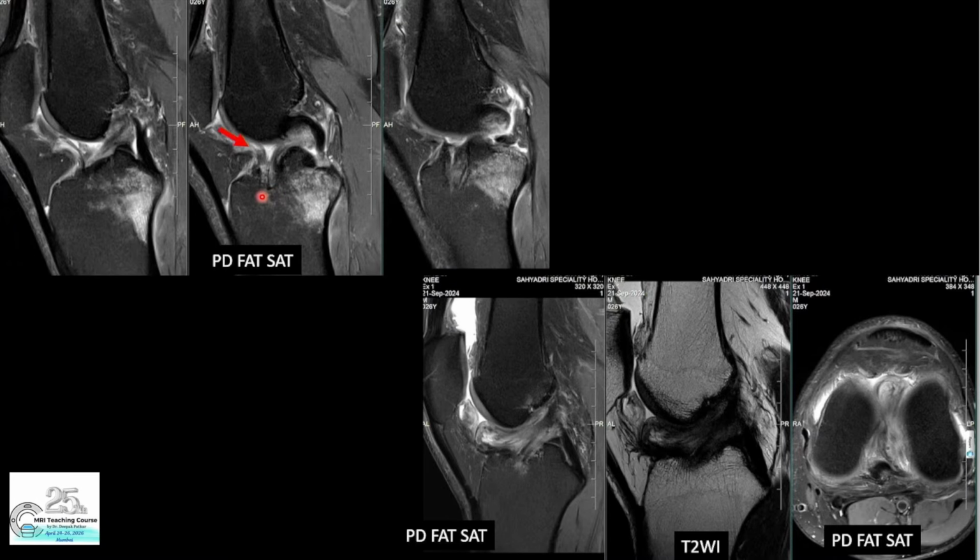First of all, these native ACL fibers will carry a little bit of proprioception from prior to the surgery, and then that proprioception can be transferred to the ACL graft. Also, it acts as a scaffolding for the new ACL graft, and it also serves as a guideline to the surgeon as to where to drill the tibial tunnel. So that is the reason why these fibers are left behind, and sometimes you can get very large cyclops formations like this.